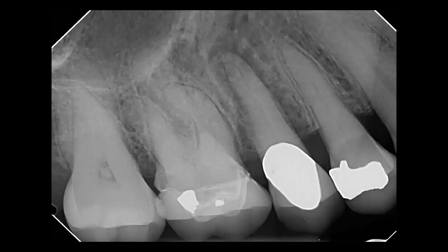By far, the most common question I receive from dentists regarding CT scans is, can a vertical root fracture be detected on a CT scan? The easy answer to this question is yes and no. Some fractures, such as the one present on one of these teeth, are not visible on a conventional film. However, when we look at the CT scan, things become much more apparent.